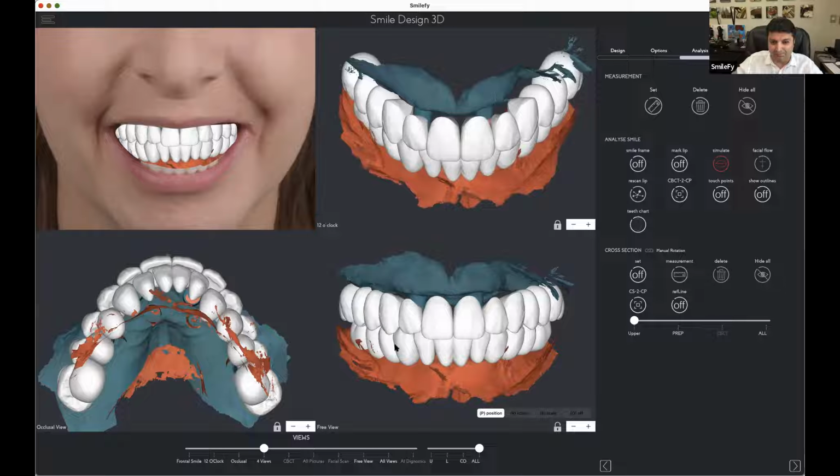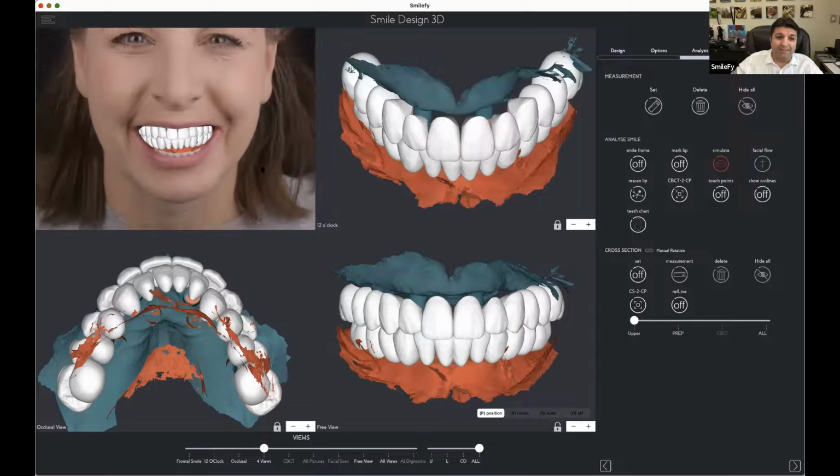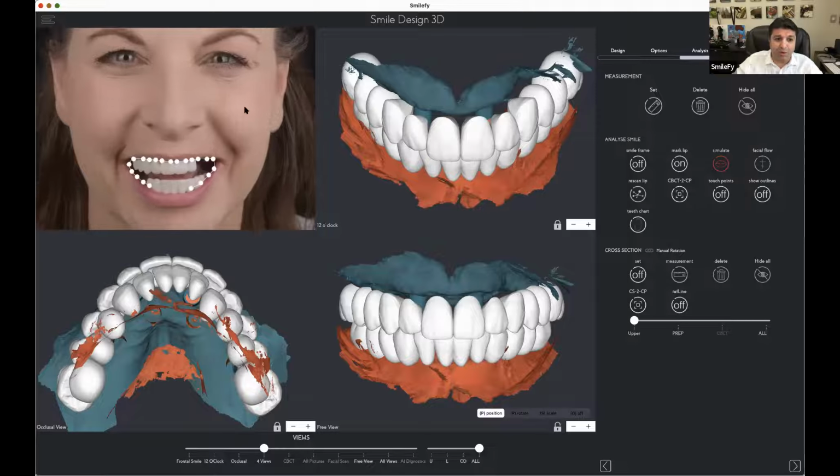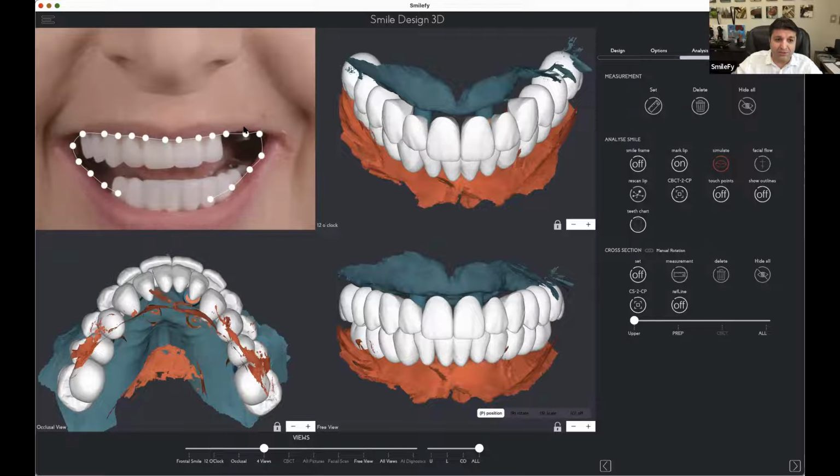Upper lower jaw, right? Now, the difference in the workflow is that when we have something like this, I'm gonna add to the calibration a new option to calibrate the lower jaw, also based on the jaw position of the patient.